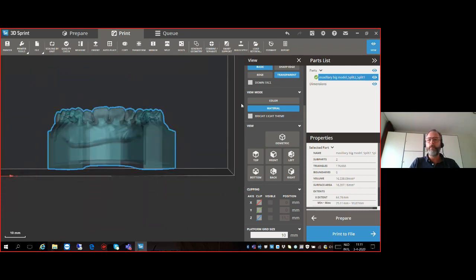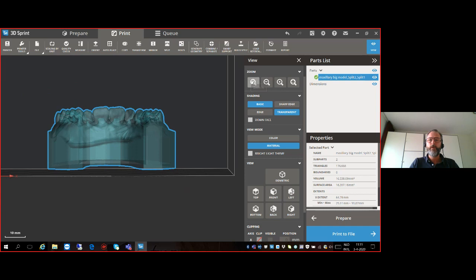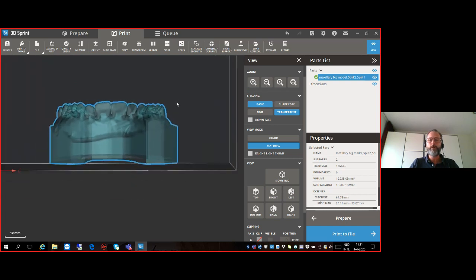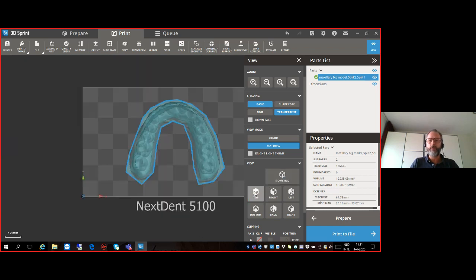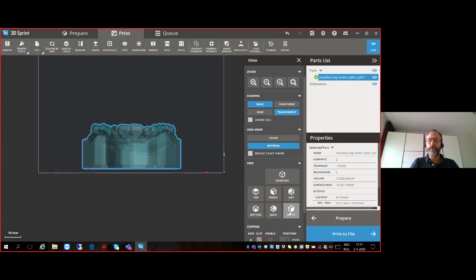When we open this window, we also have other opportunities. Here we have the opportunity to zoom. This can also be done by using the mouse wheel, which is my preference. But if you are used to using these kind of buttons, there's the option as well. We also have these buttons, which can, of course, we know this from similar software packages, you can select the different orientations.